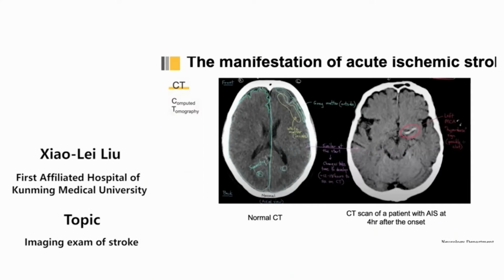The skull is with the highest density. We can see nice, fairly well delineated curves of the brain tissue here.